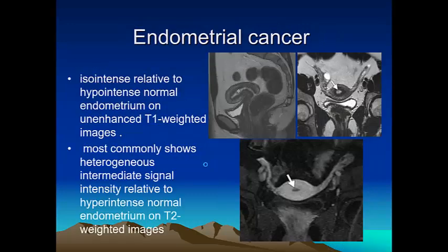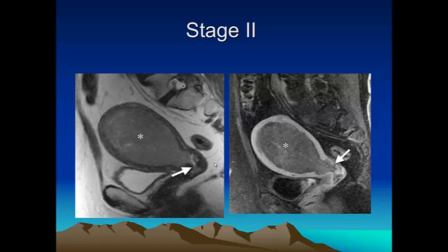Another case, a very small endometrial lesion here, but it takes enhancement on the post-contrast. So this is very, very early endometrial carcinoma. Staging, we have to put the staging accordingly.